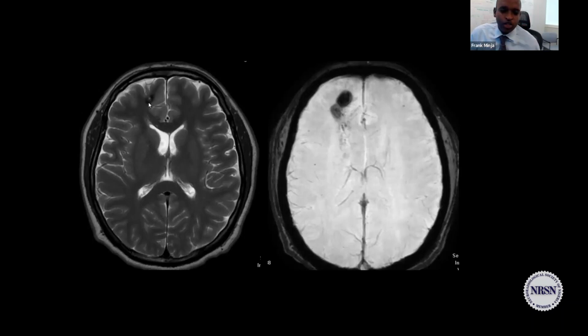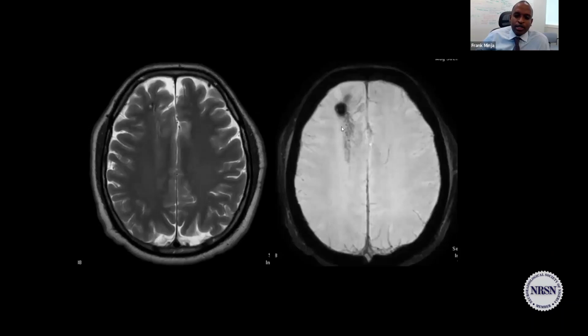So this is a situation whereby we have a twin lesion. You can see this beautiful medullary appearance of those veins, like nice little branches. An AVM is not going to have nice little branches. The moment you're saying branches, you're not describing an AVM. An AVM is an abnormal tangle of vessels. It's not abnormal branching of vessels. So anytime you have little branches, you're not describing an AVM.